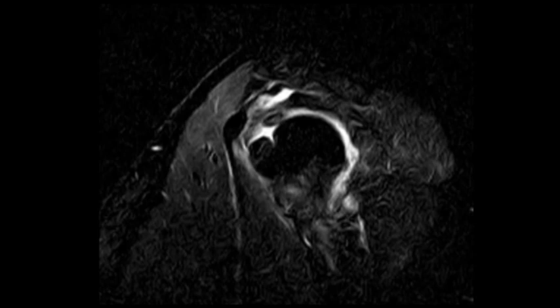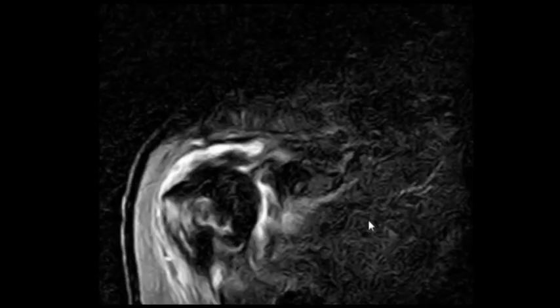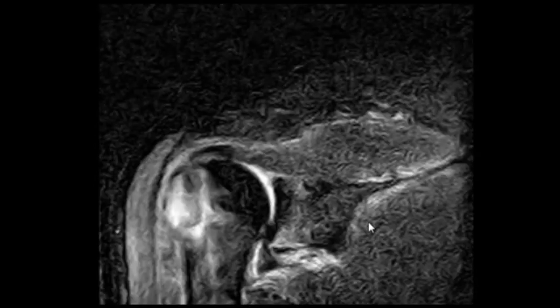We should also check the tendons. Sure, definitely you should check the tendons for any tendinous injury. I don't think nerves will be visible on this quality of image. It's not good quality, I know. And of course, there is a shoulder joint effusion. There is some edema of the surrounding muscles, as expected.